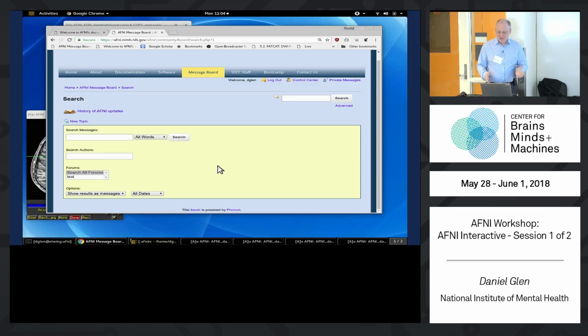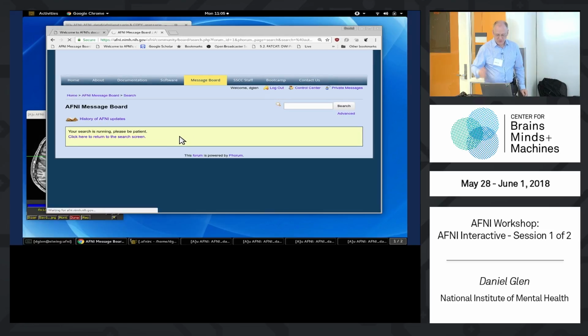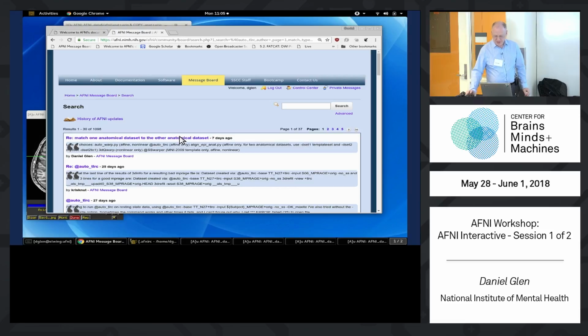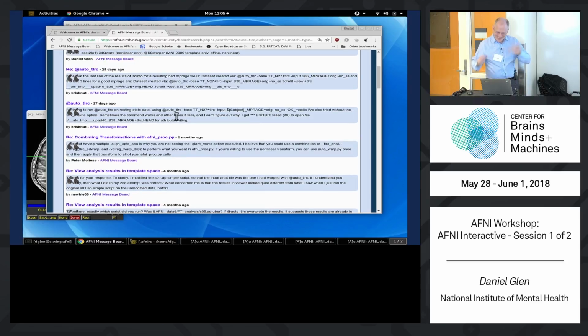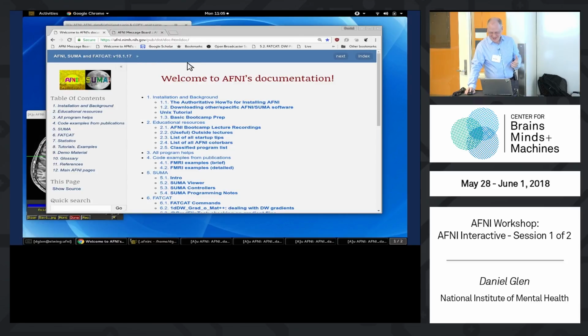So if you have a question about a particular topic, let's say you want to know about @auto_tlrc, one of our alignment programs, you can go there and say search, and it will search through time, and it finds there were 1,098 questions about @auto_tlrc. Kind of surprising. So, lots of different questions.